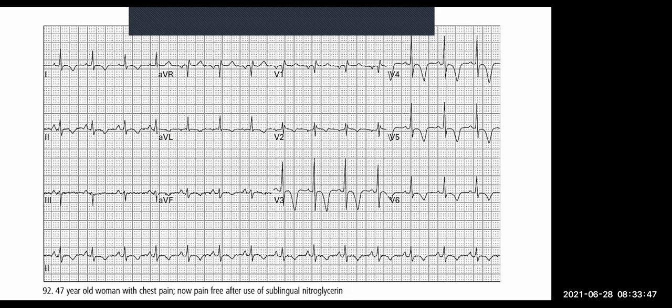Okay. And then let's come across to the other side. So we remember V5 and V6 are the lateral leads, and leads 1 and AVL are the high lateral leads. All right. So these are supposed to give you a similar picture altogether. So what do we see in lead 1? Also this inverted T wave, all right? Maybe an ST elevation. Here we see again a slight inverted, long QT, things like that, all right? So there's quite a few things that are happening. And then the last one is AVR. And what do you see in lead AVR?